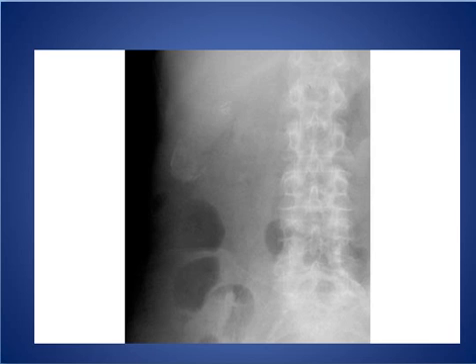and this calcification is associated with stones and associated with malignancy. The patient can be asymptomatic. But recent studies said that the association between porcelain gallbladder and adenocarcinoma is a weak association, especially in patients with diffuse calcification, and there is no risk of cancer. These are the new studies. We don't know if it is true or not, but the classic teaching is that it is associated with cancer.